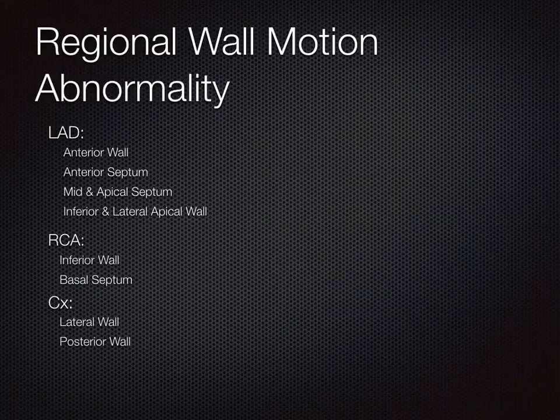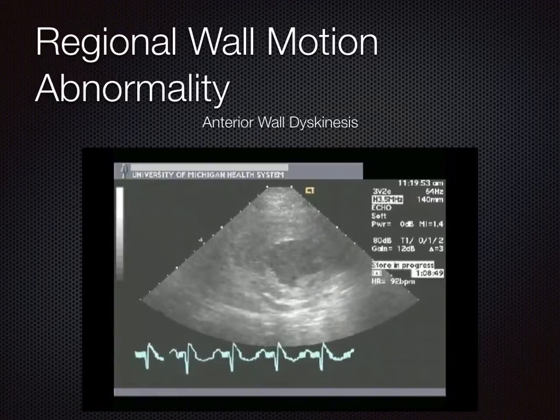Okay, so remember, this is just to summarise exactly where you would expect to see it. And as we said earlier, you're more likely to see poor effort at that part of the left ventricle following occlusion well before you see ECG changes. So this is anterior wall.